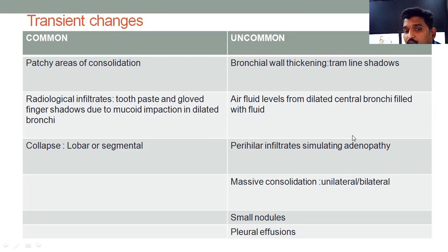Perihilar infiltrate simulating adenopathy can be seen. A massive consolidation can be seen. Pleural effusions are very rare, but you cannot deny that in some cases of ABPA, it can present with a pleural effusion.